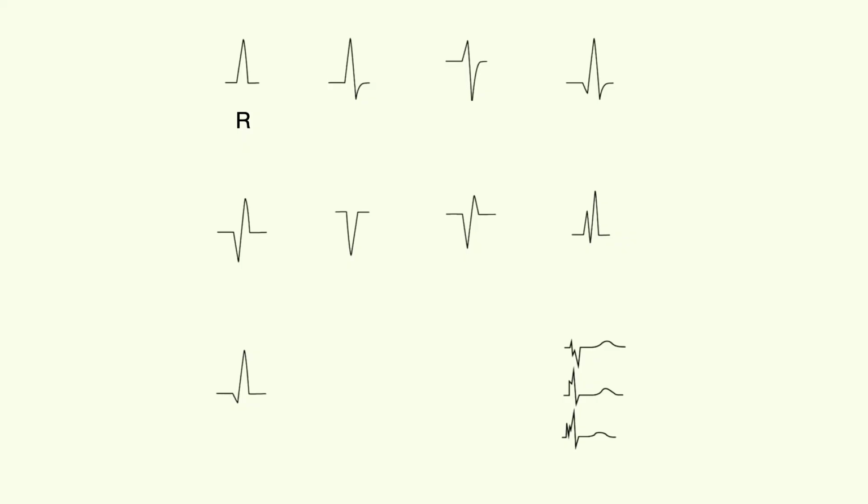Now this second wavefront, you can see that there's a predominant positive spike, the R wave, and then at the very end, there actually is a little S wave. There's a terminally negative component. And sometimes people will kind of play with the casing of the font to convey a little bit. That's not scientific. That's just kind of colloquial, basically. But you'll see that. So then the next one, you have a smaller R wave and then a bigger S wave. So you can call that an RS. Again, these are all QRS complexes. So you're kind of seeing where this is going.